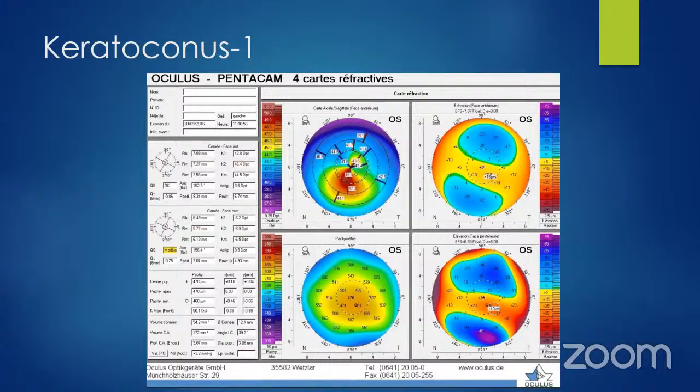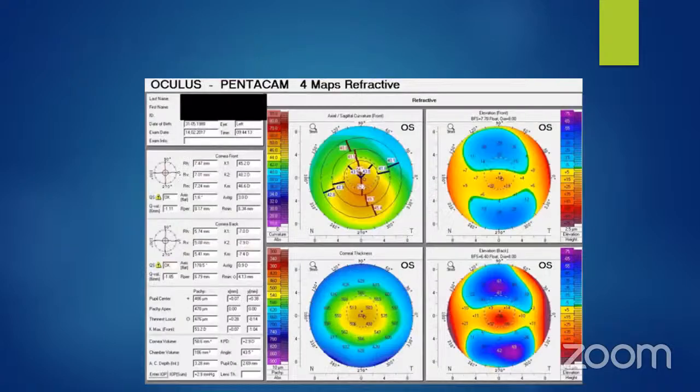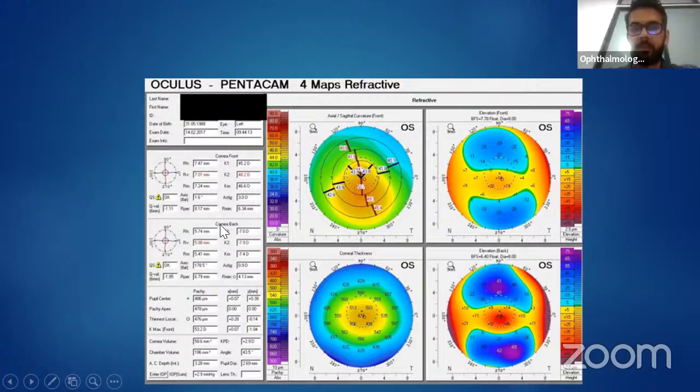Usually they'll not give a very complicated Pentacam. But you should not just jump into it. So the idea is to say, okay, I'm looking at the first quad map, which is showing, again, see, there is a steepening inferiorly in this one also, right? Yes, ma'am.